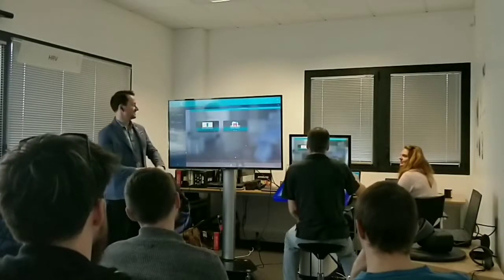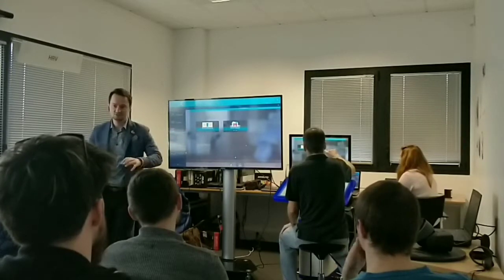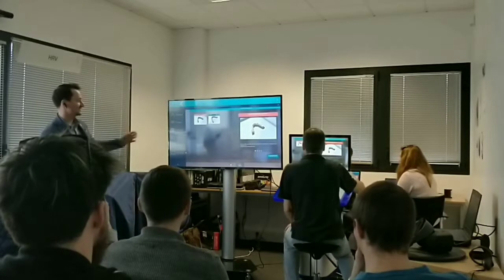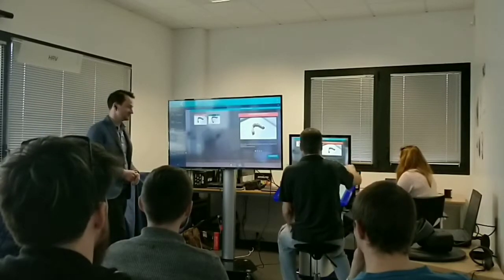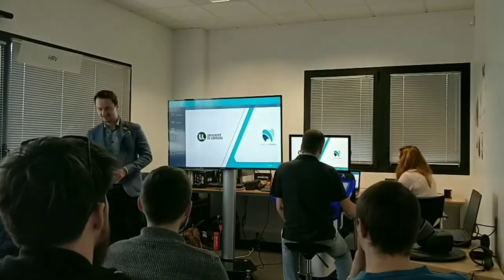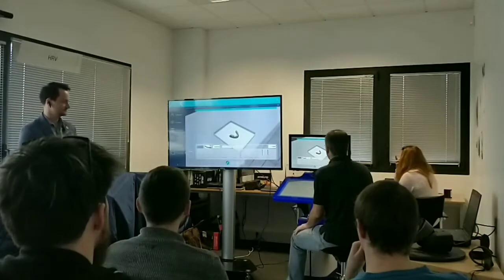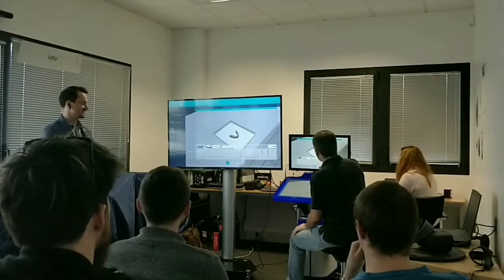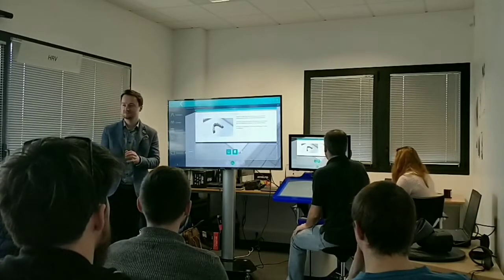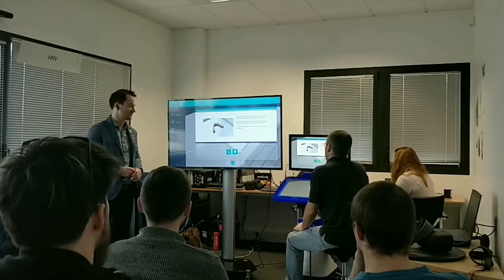Perfect. So here you can see we only have access to the exercises which were put in for this student. So here we can launch an exercise for restoration. And you'll see the logo of our university up on screen. Fantastic. So now we have a simulation that can either be done with teeth on a plate, or we have an entire virtual patient that can be used as well.